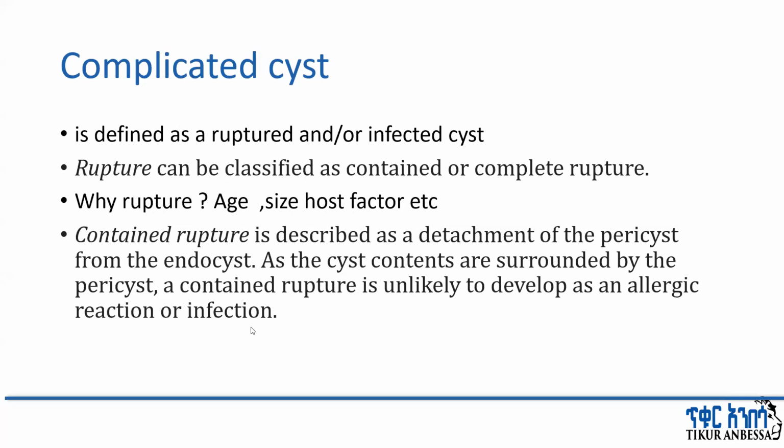Contained rupture is described as a detachment of the pericyst from the endocyst. As the cyst contents are surrounded by the pericyst, a contained rupture is unlikely to develop an allergic reaction or infection.